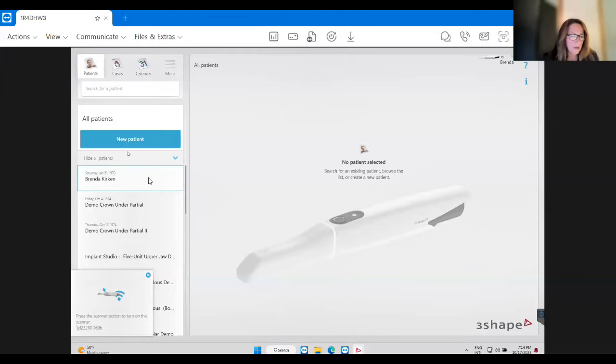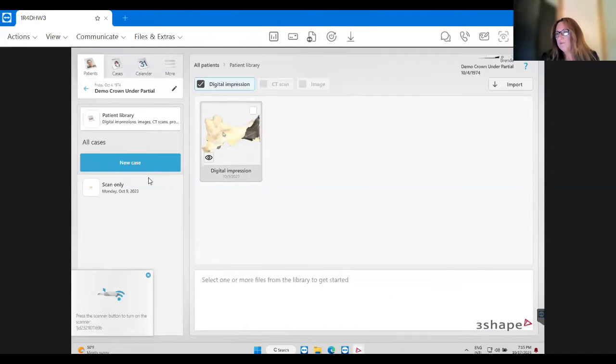Okay, so right now we're going to start off with a tooth underneath the partial. And I took a couple different scans. There's different ways to do this. Let's say the tooth is made whole and fits the partial. Maybe there's an existing crown with the rest seat and has a leaky margin. So we know we need to cut that crown off, but we would like the lab to duplicate what is there already. So I have an example of what we would do.